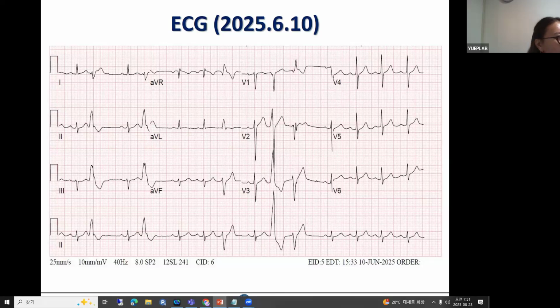Yeah, because when you involve the septum, your septal fascicle cannot manifest, because your preferential conduction is going to be mostly the posterior fascicle. That's the thickest fascicle you have. With the networking, diagnosing a left side septal PVC is the hardest thing to do on ECG, because whichever Purkinje conducts faster is going to exit through that. So this is challenging.